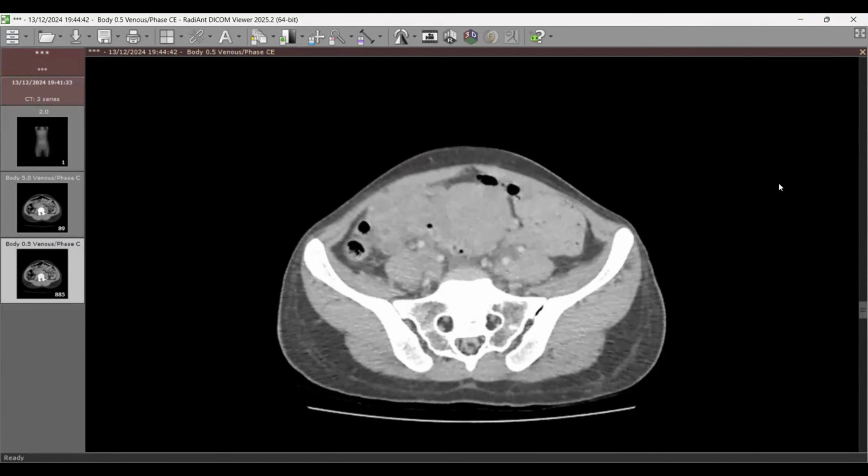As I can see, the uterus is also enlarged with some endometrial fluid, and there's also the right adnexal collection noted here. I would first of all like to correlate with the history of the patient, whether the patient has any postpartum history, recent fever, or some infection process going on.